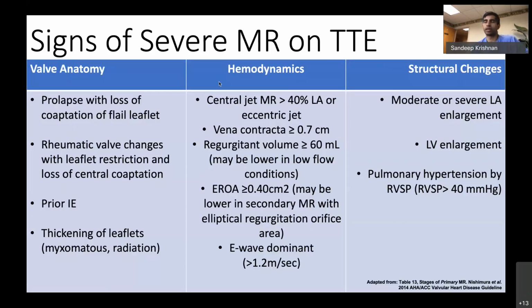And one thing that I see a lot of is that you measure it in an apical four-chamber view, and it looks like it's normal, at least by left atrial volume index. But then suddenly you go to the subcostal view and you put your probe down. I don't know how many of you are actually looking for this, but if you look at the left atrial size there, sometimes the left atrium is twice as big as both ventricles. And in that case, that tells me that this patient probably has more severe left atrial enlargement than we realize.